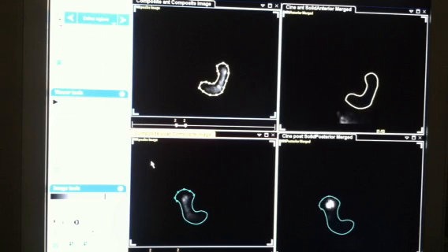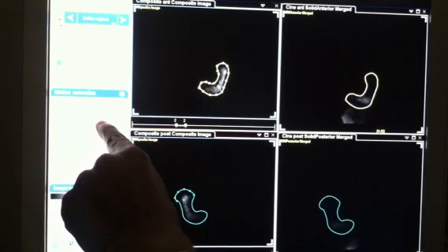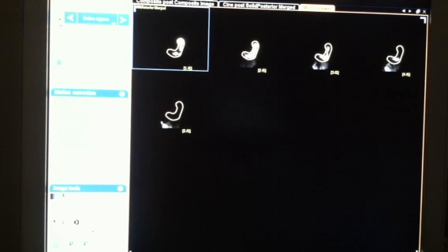Alright, now from here we're going to line all these images, stack them up together, get the motion corrected here. So again, we go to motion correction, we pick anterior. It's going to bring this up here in the splash page. What I like to do is bring up the intensity to get it real nice and bright inside that region of interest. I can really see what's going on there.